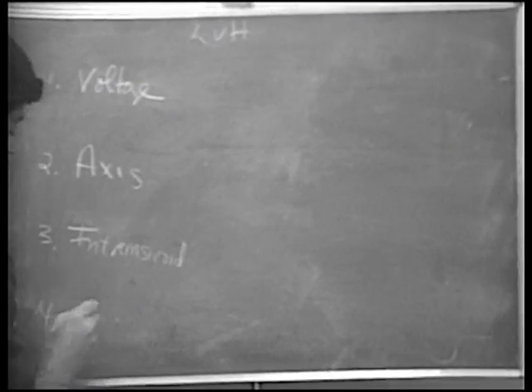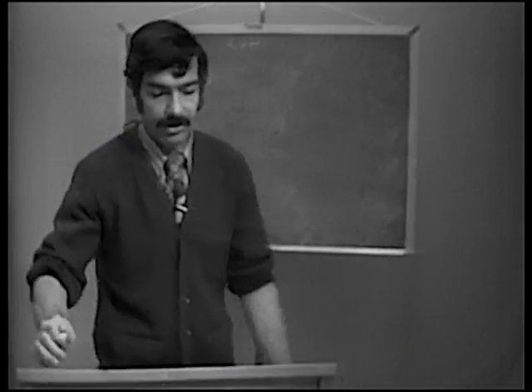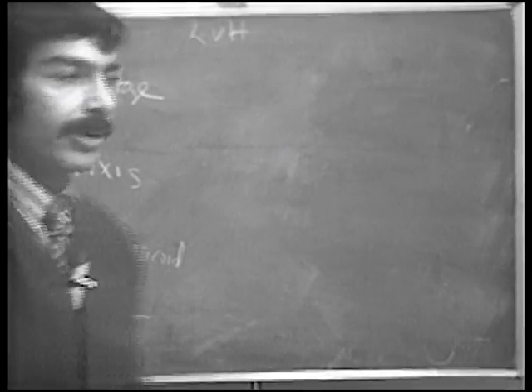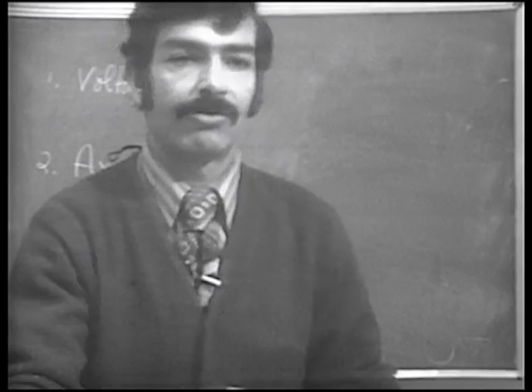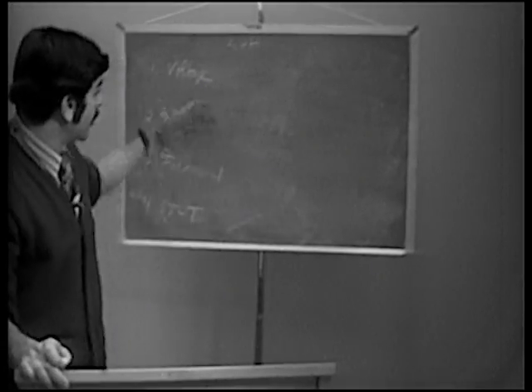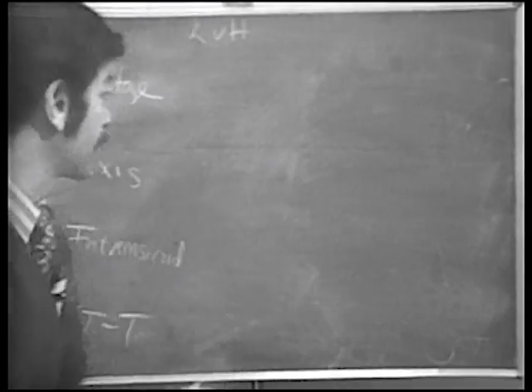And the fourth one would be ST T-wave changes. Okay, so this is the basic outline that we're going to want to follow. And in part of our routine for reading electrocardiograms, we're going to ask ourselves, does this patient have ventricular hypertrophy? And when we're asking that question, we should go right down this list. Voltage, axis, intrinsicoid, ST T-wave changes.